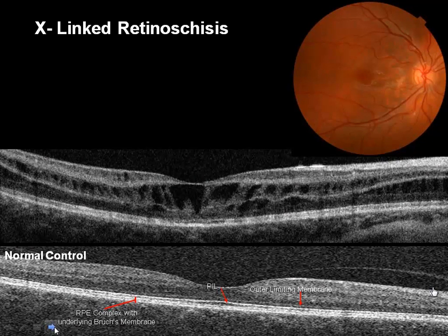And this patient has a condition called X-linked retinal schisis. In this specific case, it wasn't an obvious diagnosis. These typically affect little boys, ages 4 or 5 or 6, when you start to get reduced acuity, maybe 20/60 or so, typically in both eyes. If you do an OCT, you get this pattern. So that's X-linked retinal schisis.